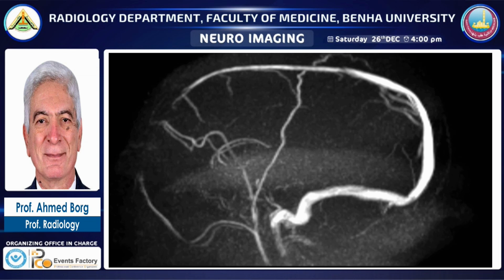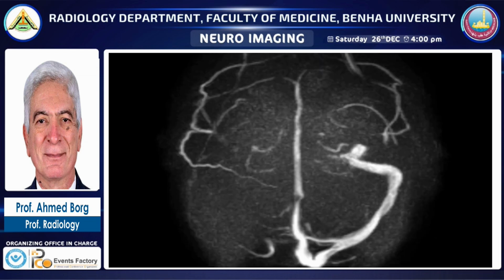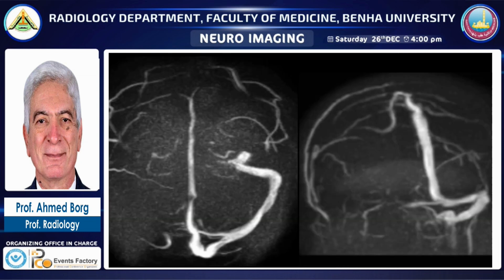And now this is the one crucial image, where are the sinuses, the deep venous veins here. Internal cerebral veins are not shown. Vein of Galen and straight sinus are not shown. There is no flow signal in them. Again, transverse sinus, no signal.